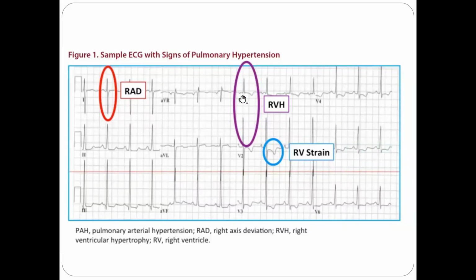And also V1 is kept on the right side of the chest, on the right side of the sternum, whereas V2 is on the left side of the sternum. Because of right atrial enlargement, the right ventricle is shifted downwards towards the left side. So in V1 generally the QRS amplitude is found to be very much less when compared to lead V2.